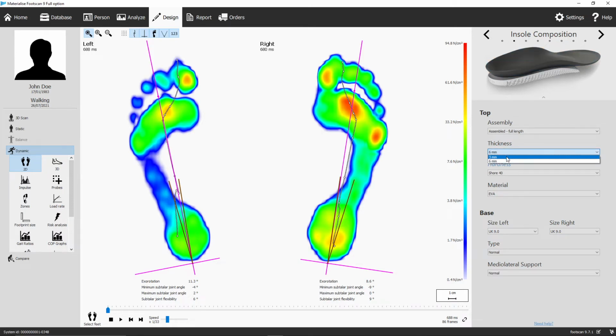When a correction has a black title, you overruled a suggested value, or you still have to choose the correction yourself. Remember, you are always in control of the design. The suggestions can be seen as a first draft and can be an excellent baseline to start your design from, but feel free to overrule them if you do not agree with them.